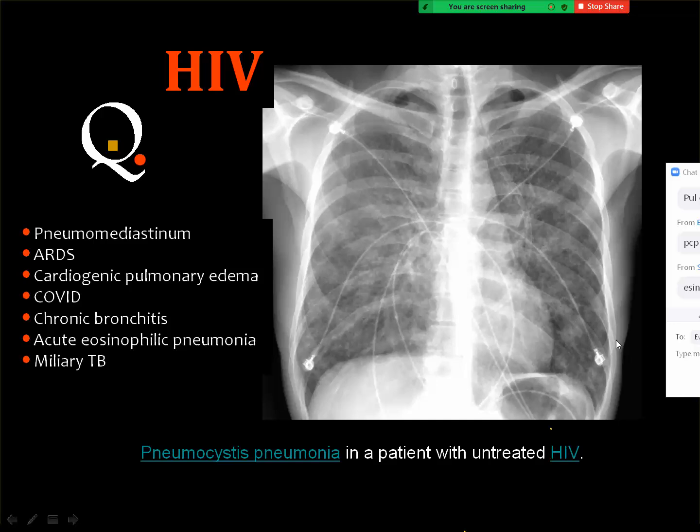Also, sometimes, because of the immune compromise of the patient, you ask why this lesion is not COVID. Actually, we cannot diagnose COVID for sure from the plain film. But sometimes, because of the pandemic, we assume that the changes in the lung may be related to COVID.